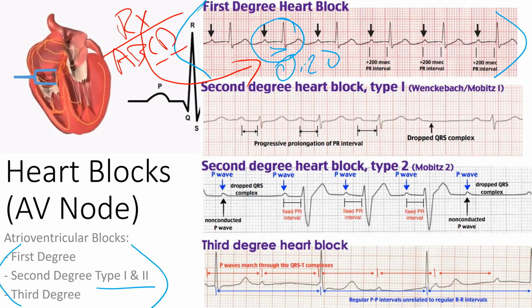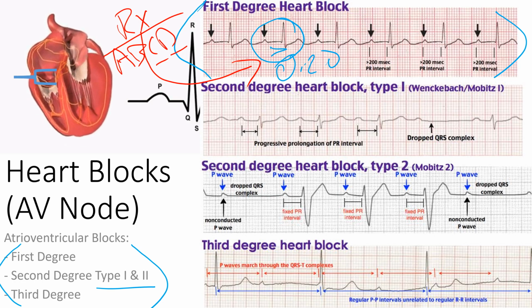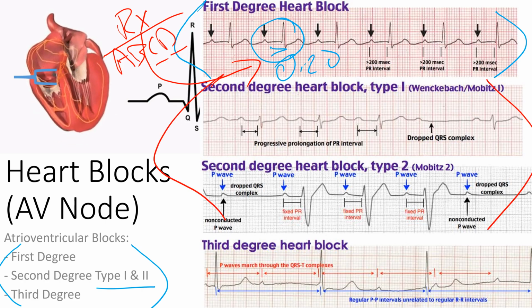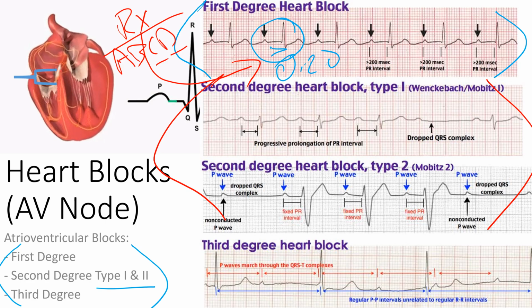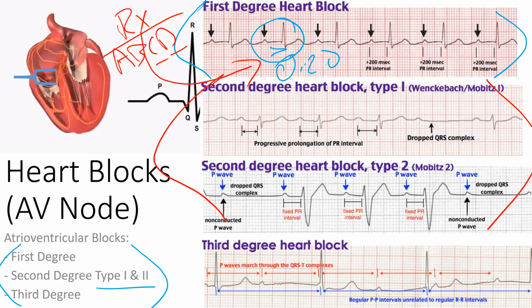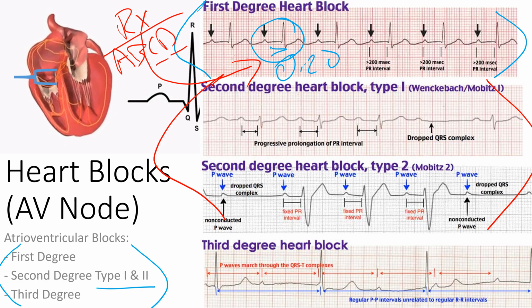Anyways, we got a PR interval that's prolonged. If you keep giving those medications because you didn't notice, oops, I forgot, I got 4 patients, I got 75 meds to give, I didn't realize that was going to prolong my PR interval, now you're going to go into a second degree block, most likely, right? Maybe it was your fault, maybe it was iatrogenic, meaning it's like, oops, I did it, or it was because the patient took too much other medication at home, right? They took too many of their beta blocker pills, too much of the digoxin pills, or they're taking their digoxin for years and now they developed acute kidney injury or chronic kidney disease because of their long-standing diabetes or hypertension, and that could be the reason why they're dig toxic.